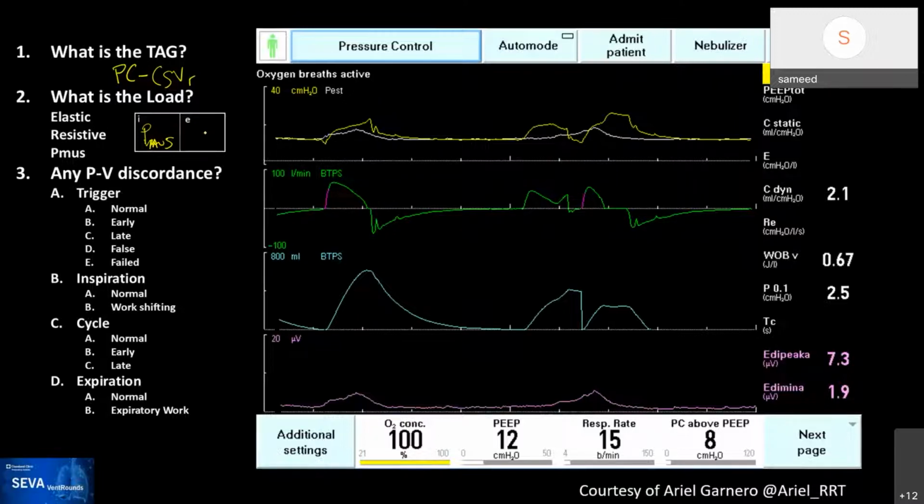And I think expiration, I would say it's finishing within 1.5 time constant. Maybe it's more elastic, just because it's taking 1.5 time constant, which is fairly short. But then it resists to 0, so I don't see any other resistive component there.